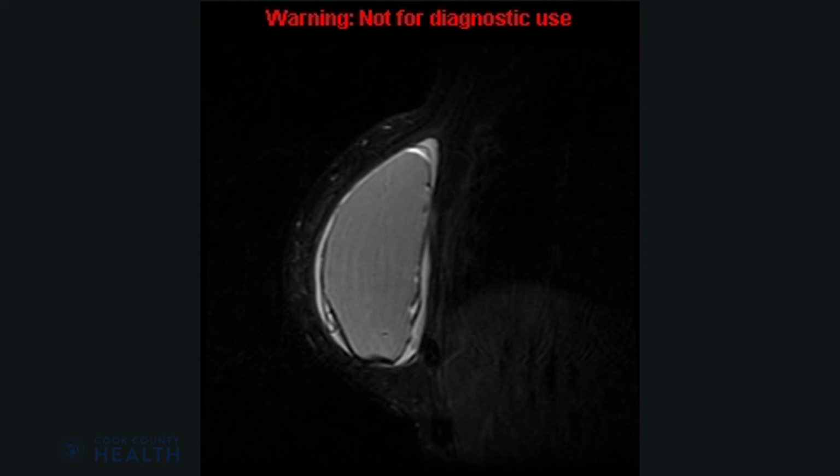And this here is an MRI of the breast. This patient had bilateral retropectoral silicone implants. These are surgical procedures done to, again, enhance the female attributes of a breast. There are bilateral intracapsular ruptures, which you might see also in cisgender females that have implants. So this is the implant itself, and this darker edge to it is the capsule, and beyond that capsule there is silicone, which would be identified as a silicone rupture that can be seen again in cisgender females, however this being in a transgender female.